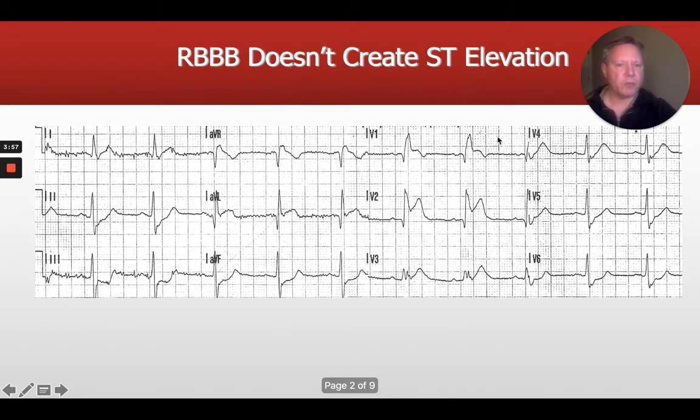And that has depression. So clearly we have two in the septal lead, so we can call this a septal infarct with a right bundle branch block. And it's probably going to end up being something larger than that, probably going to be the septal.